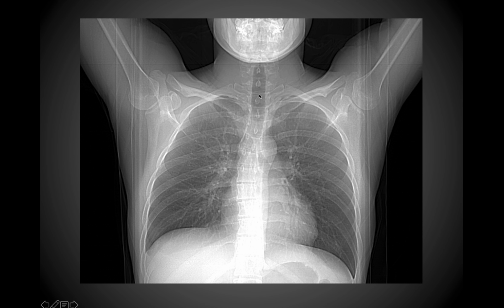And then as you follow the trachea down, eventually you'll see the carina, and then you see the branching of the left main stem bronchus. You can see that outlined right through here. And this is the left main stem bronchus, and then the right main stem bronchus located right through here. If we put the overlay on top of that, you can see the basic orientation. Remember, the right main stem bronchus is going to be more vertical than the left, and so typically foreign bodies are going to lodge in that right main stem bronchus, and we'll look at that a little bit later.